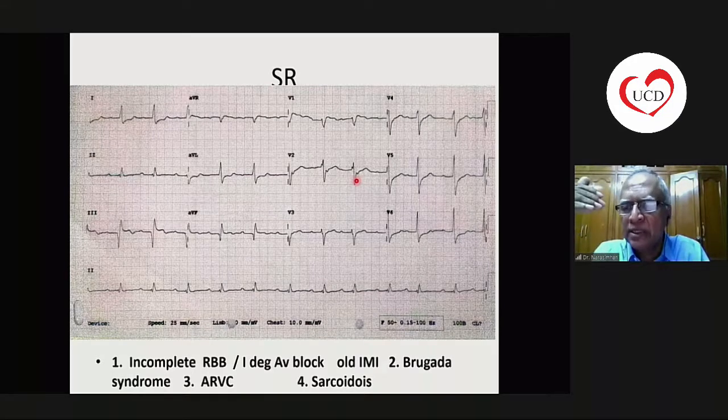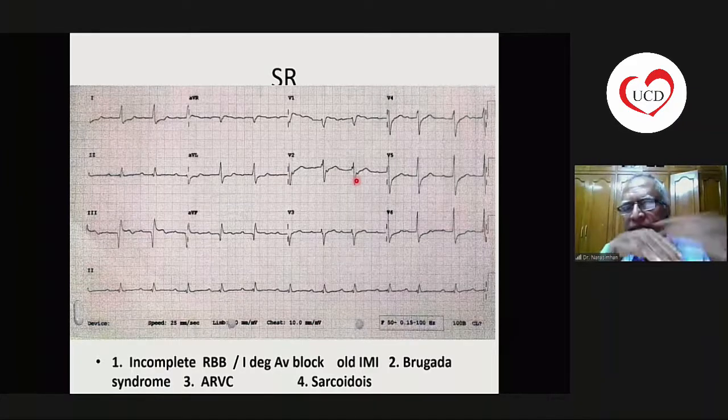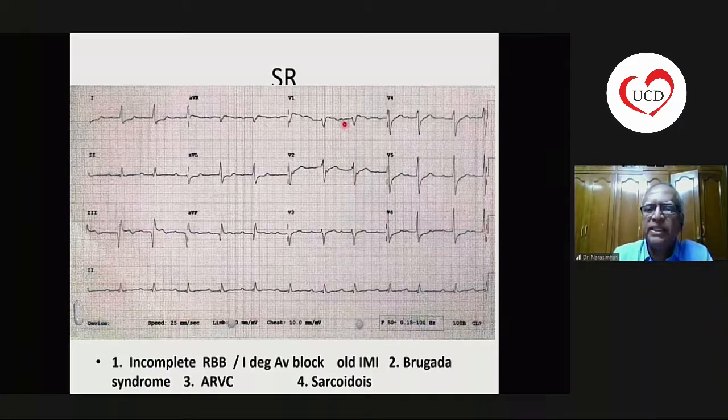It is not. We feel that this is an underdiagnosed entity, and usually the ECG gives a lot of clinical clues to this diagnosis. And similarly, this is a terminal delay, which is suggestive of abnormal myocardial cell-to-cell conduction. And these are the reasons why we suspect it. But your point is well taken.